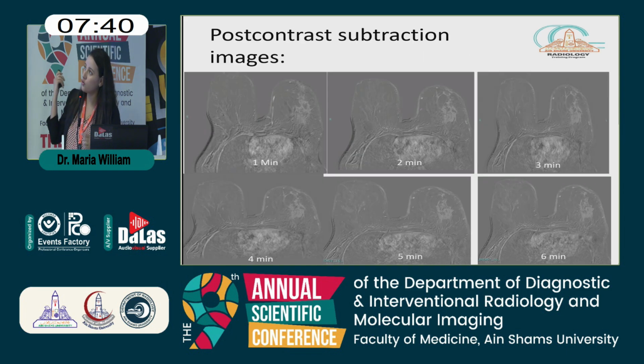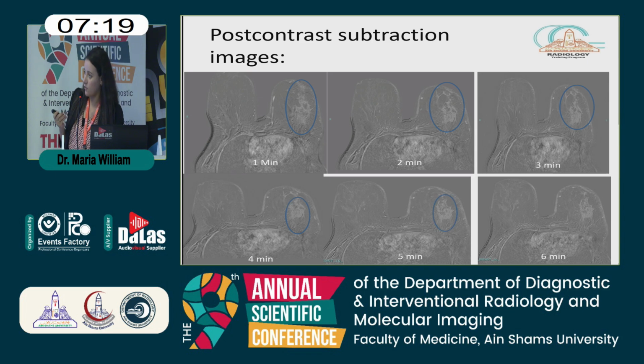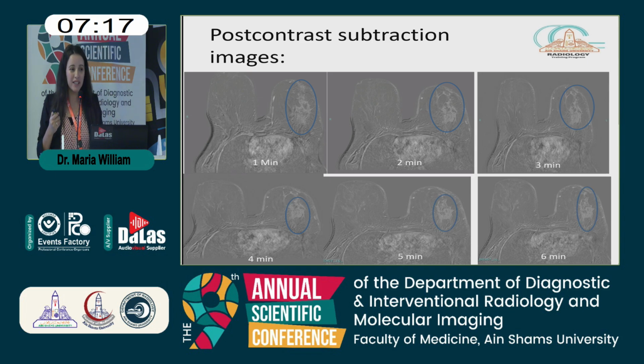Then we will come to the post-contrast subtraction images. We take post-contrast subtraction images at 1, 2, 3, 4, 5, 6 minutes. Okay. We can see a slight increase in the contrast enhancement rather than stationary contrast enhancement.